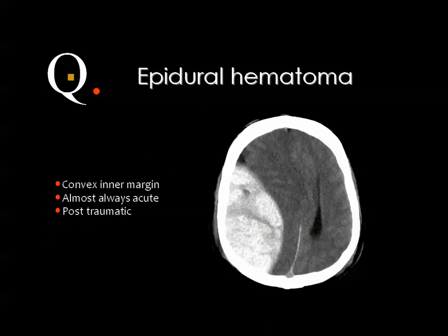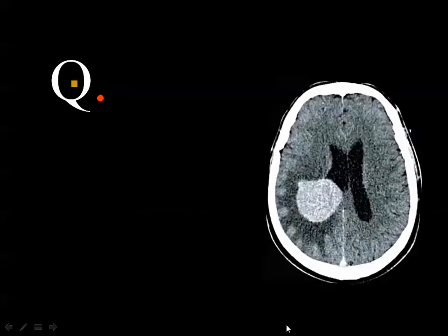And this is epidural hematoma. And we also said something about this relative hypodensity within the hematoma itself. And how can you explain this? Yes, so this is hyperacute blood, and this sign is known as a swirl sign. Whenever you see a blood which looks like water, I mean hypodense, intermingled with the blood in the hematoma, then you know that this is acute, hyperacute blood. This is epidural hematoma.